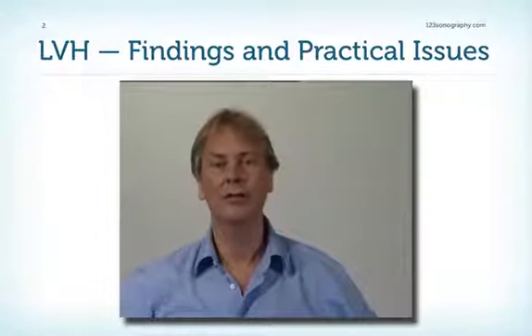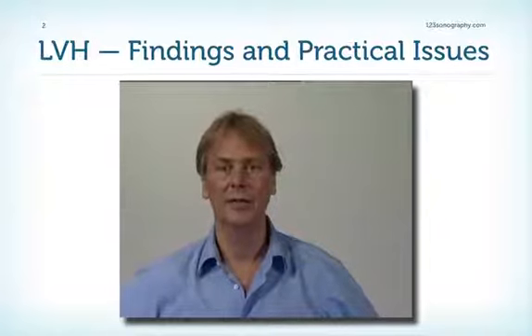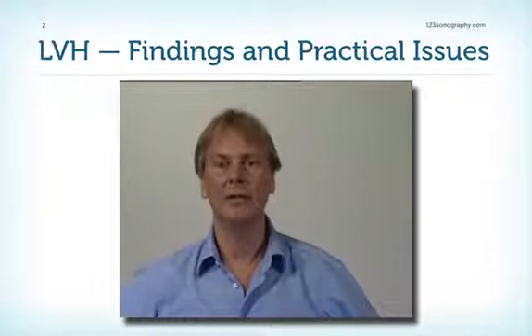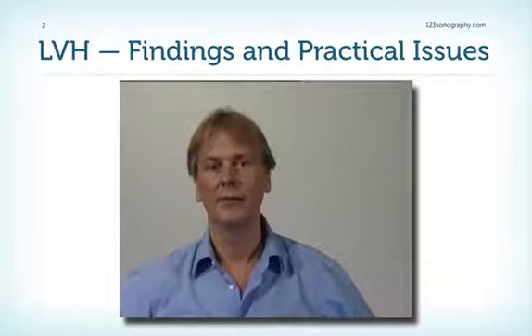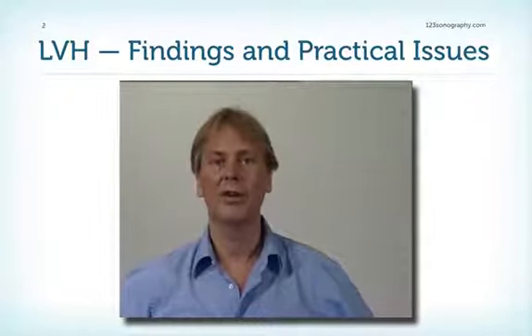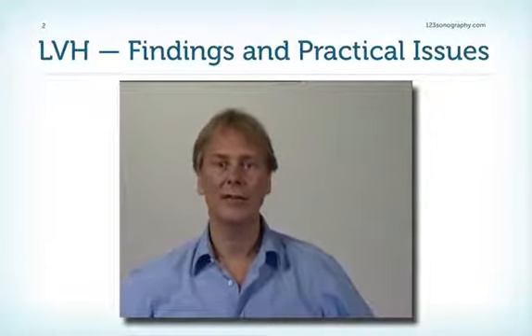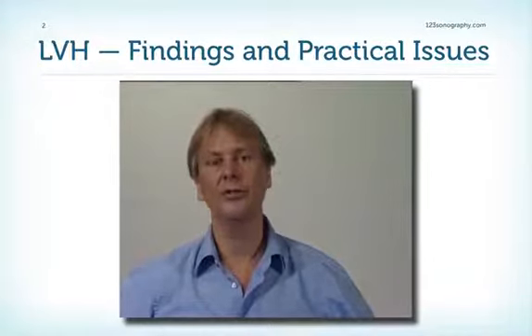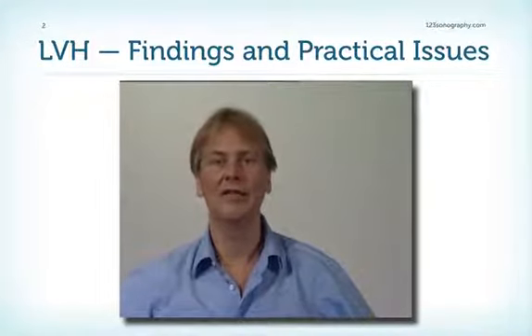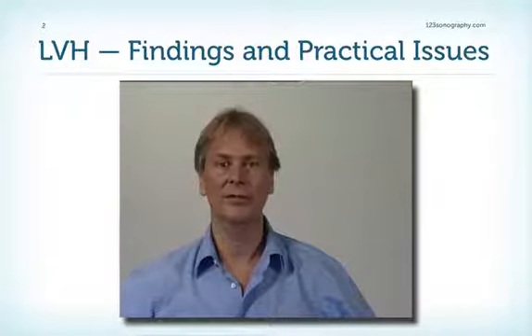Unfortunately, echocardiography is a fairly crude method to quantify left ventricular hypertrophy. There are much better methods, for example, magnetic resonance imaging or computed tomography. But you will see that with the help of echocardiography, it's reasonable to quantify LVH and to make the diagnosis in most patients. But in this chapter, I also want to show you other factors which are associated with LVH, and I also want to show you other causes of LVH. So let's take a look.